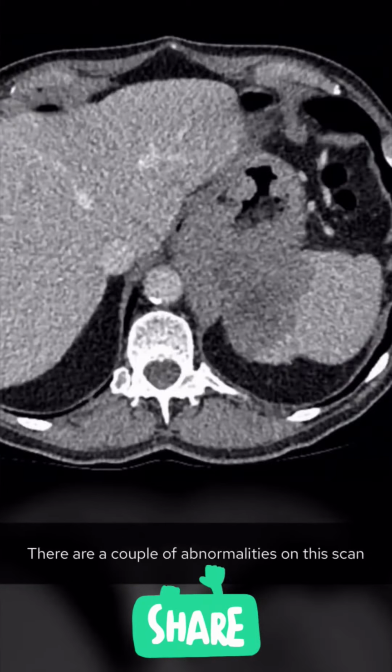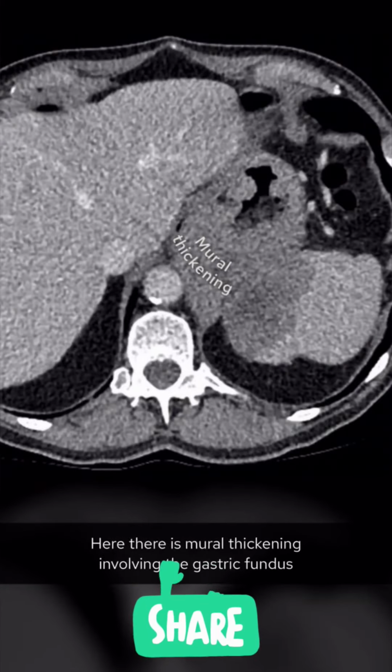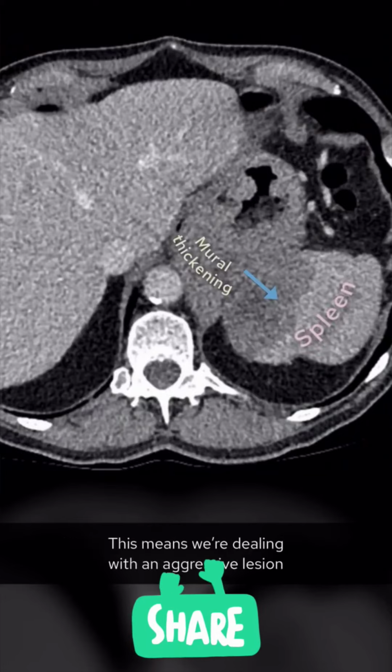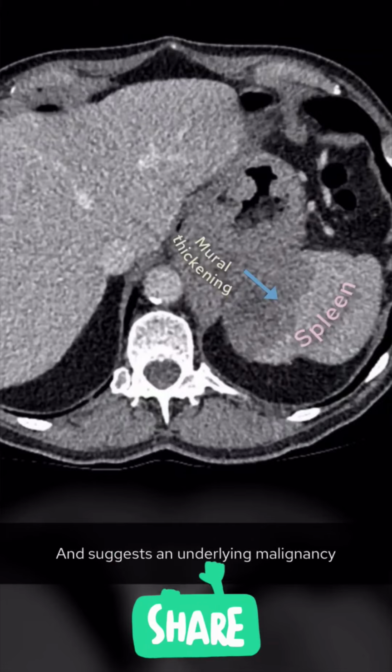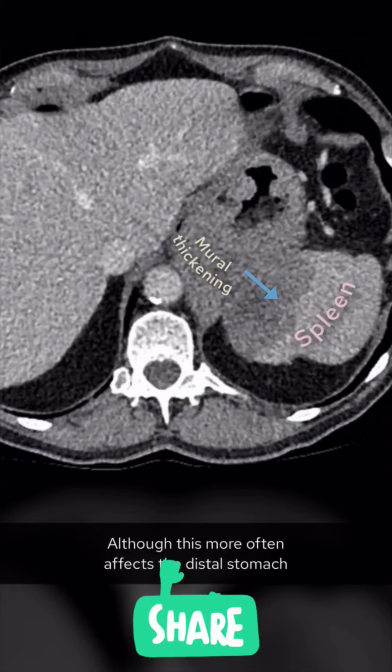There are a couple of abnormalities on this scan. The first involves the proximal stomach. Here there is mural thickening involving the gastric fundus. We can see there is extension beyond the wall of the stomach into the spleen. This means we're dealing with an aggressive lesion and suggests an underlying malignancy. We need to consider an underlying primary gastric carcinoma, although this more often affects the distal stomach.